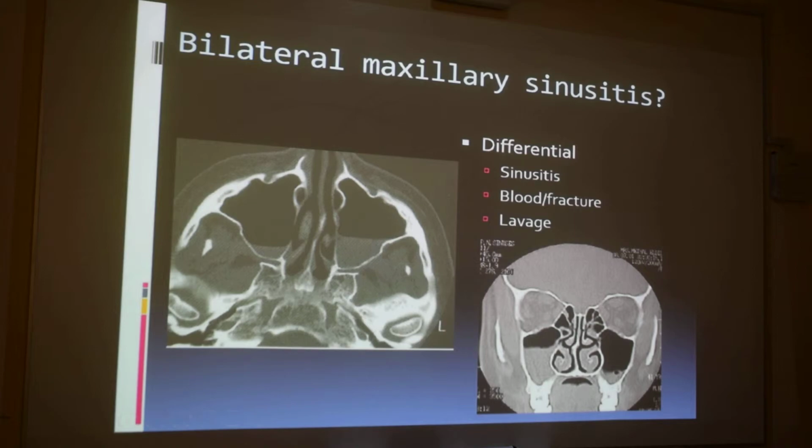In chronic sinusitis, you would not usually have a fluid level. You would have mucosal thickening and this wall thickened. The wall would get sclerosed or thickened because on and off infection results in periostitis. Repeated infections inside would result in thickening of this maxillary wall.